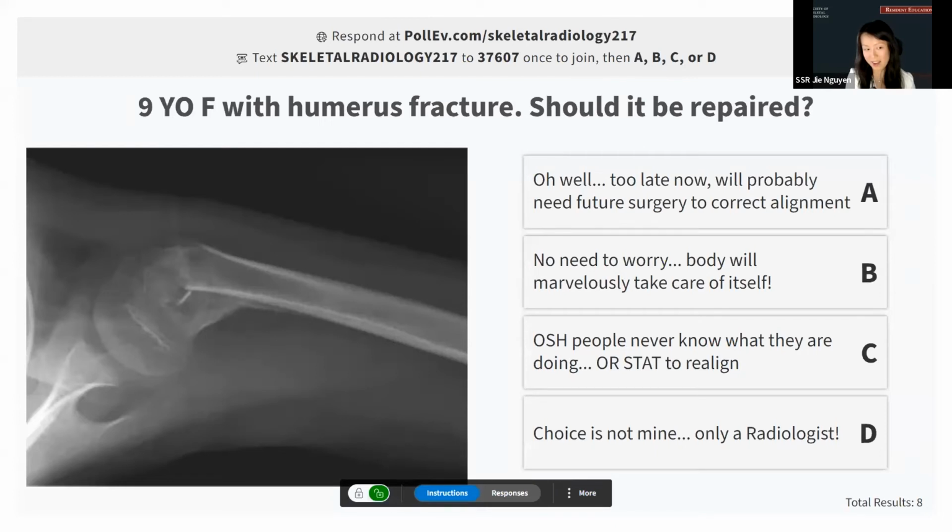So I have an attempted axillary view of the shoulder. You can see there's a fracture in a skeletally immature patient that involved the proximal humerus. On this particular view, it's kind of hard to tell whether it actually goes into the physis, but since the physis is relatively weaker, it probably, to some extent, went from metaphysis into the physis or physis into the metaphysis.